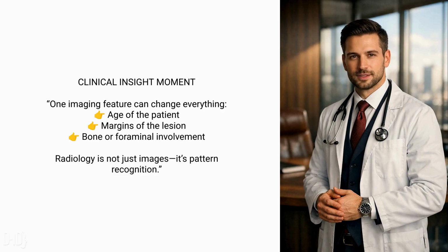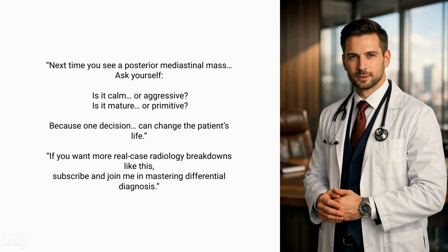Clinical insight moment. One imaging feature can change everything. Age of the patient. Margins of the lesion. Bone or foraminal involvement. Radiology is not just images, it's pattern recognition. Next time you see a posterior mediastinal mass, ask yourself, is it calm or aggressive? Is it mature or primitive? Because one decision can change the patient's life.